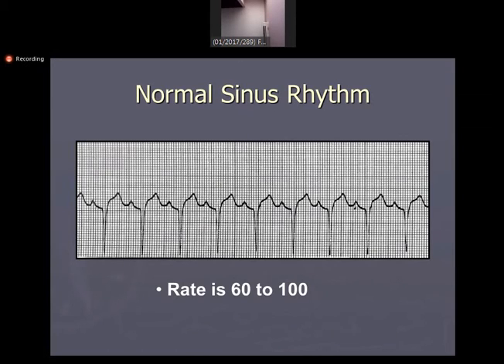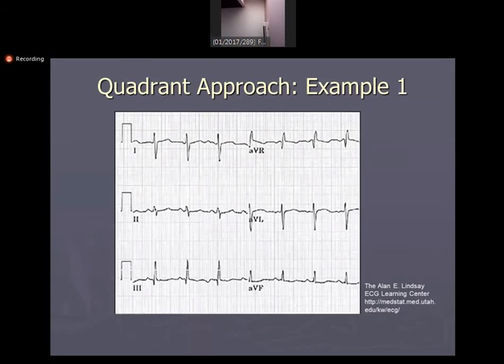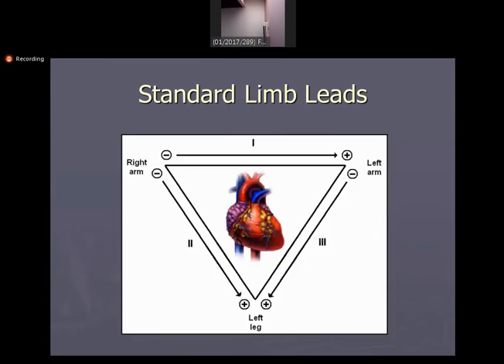Okay. So if you see here, start from the P wave. How many of you see the P wave here? Now go back to basics. Here is a P wave.